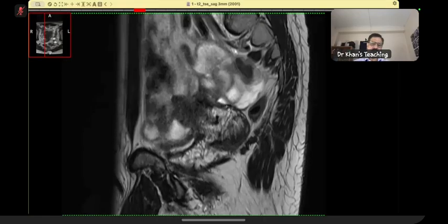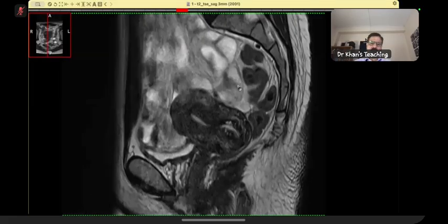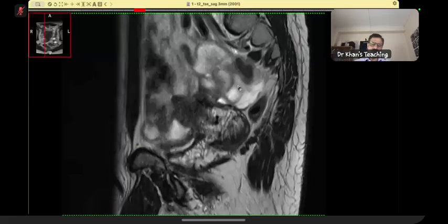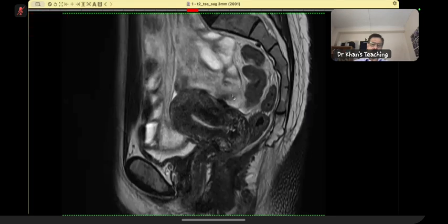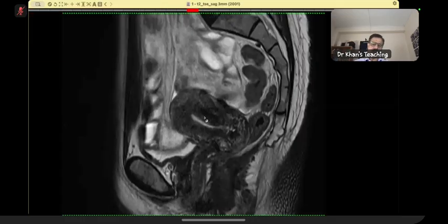And then here you can convince yourself that this plaque is actually adherent to the ovary also. Here again, if you look carefully, this was a finger-like, convoluted type of lesion. Now, whenever you see deep pelvic endometriosis or endometrioma, then also see in the same go the thickness of the junctional zone. Is there adenomyosis or not? In this case, there was no adenomyosis.